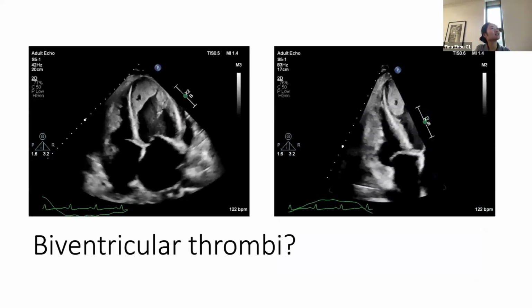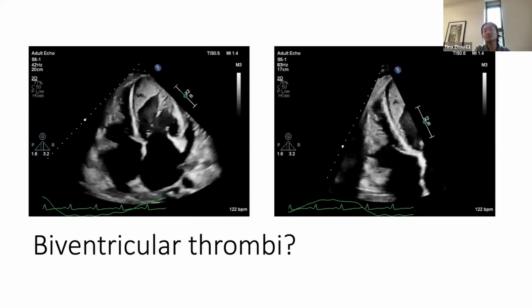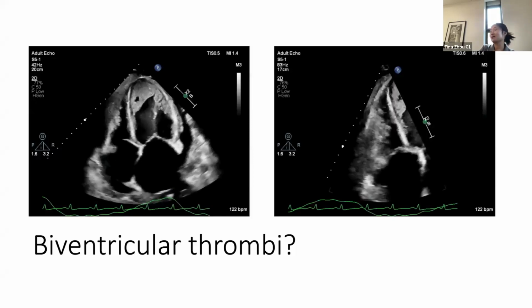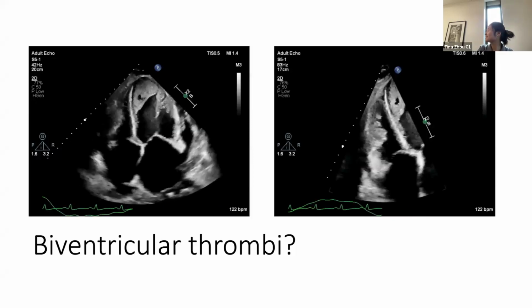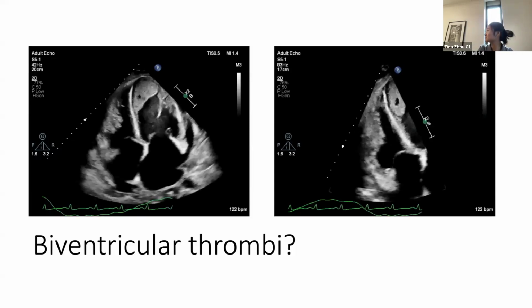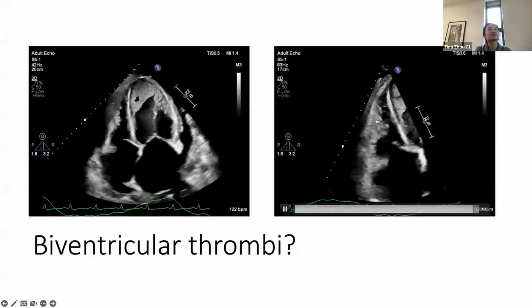Some of you might have seen this echo. Now the question: they're definitely thrombi in the left ventricle. I'm just going to give that to you, but are there thrombi bilaterally? Is my question. They do, don't they, in the right ventricle over here. That was the first offer.